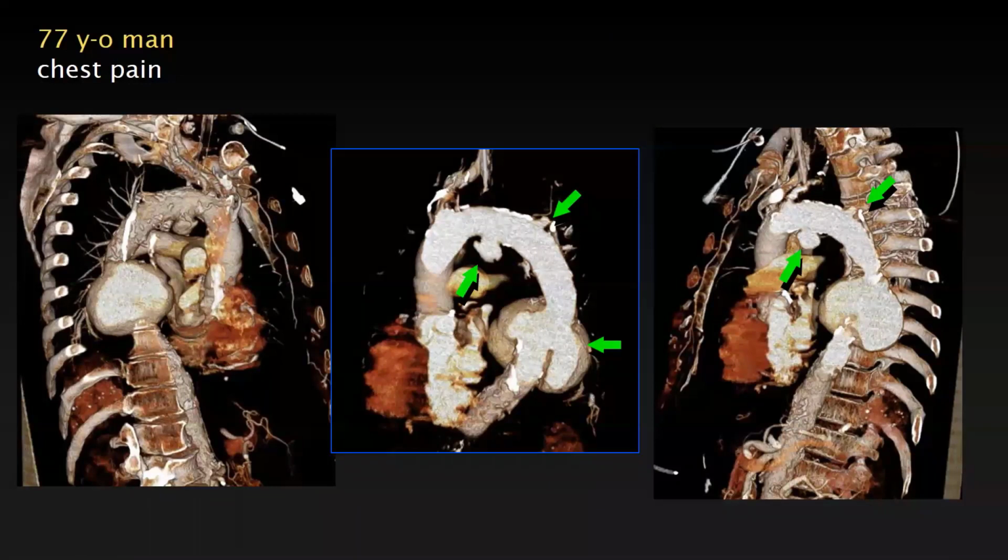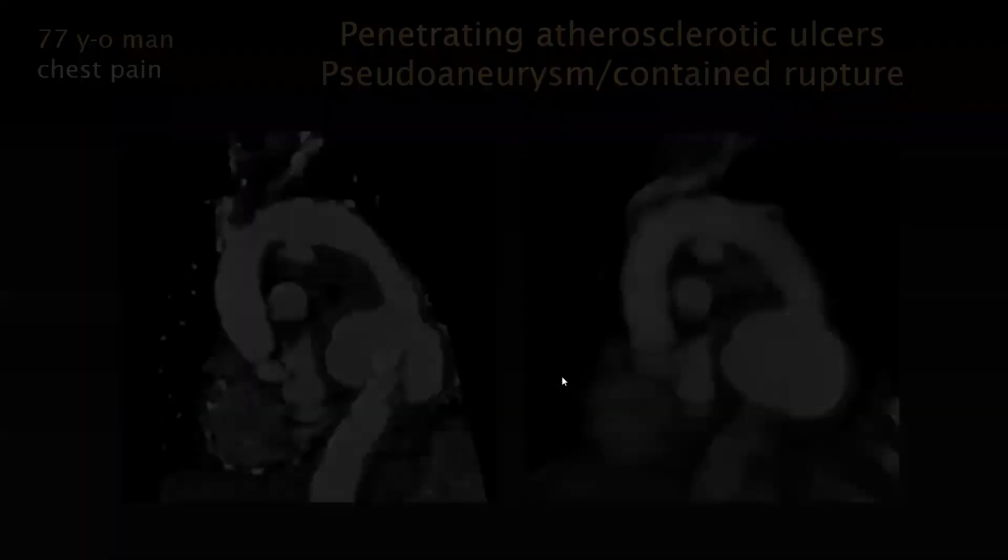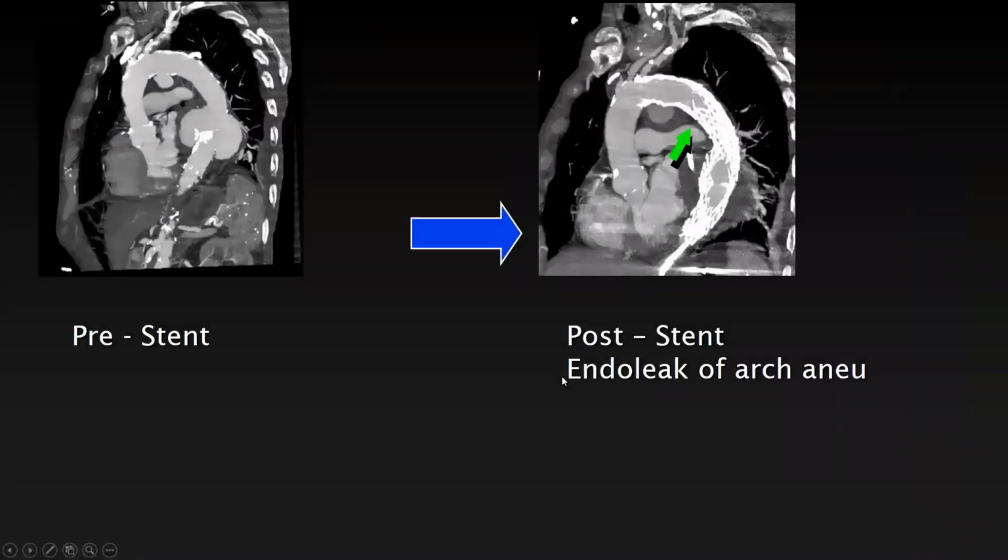So the treatment plan here was to treat it with an endograft and ideally cover this huge rupture in the descending aorta and this little outpouching on the undersurface of the arch, all with an endograft. And so this was attempted. And I think it worked relatively well because mainly this rupture was covered, and a little lesion here, but you see the undersurface pseudoaneurysm is still filling here.